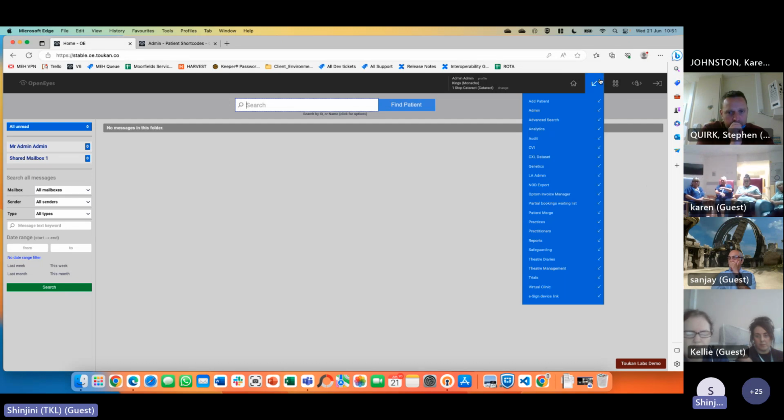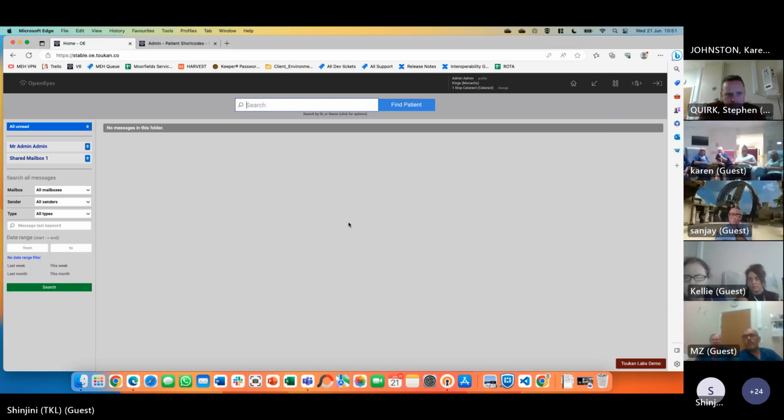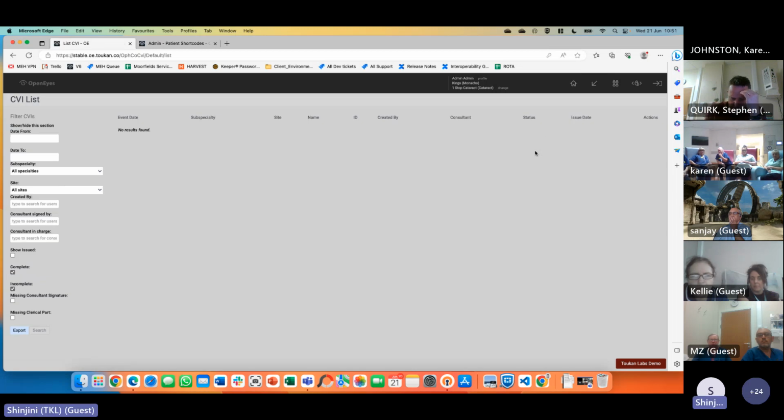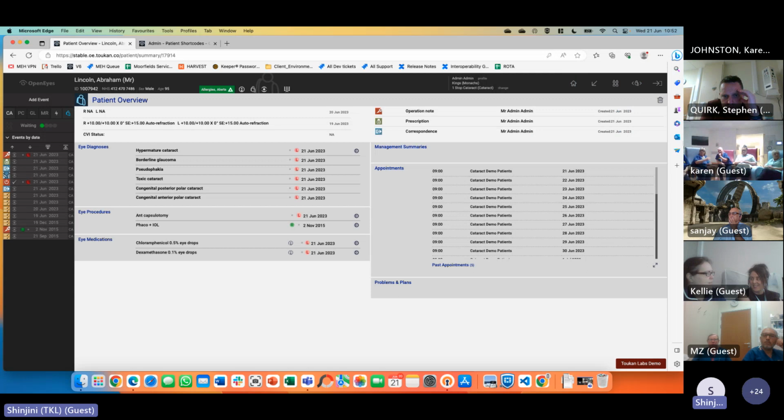Just, do you do CVI? Sorry, do you want to repeat? Okay. Right. So, what else to show? You mentioned CVI. So do you record and submit CVIs for patients? Yeah. Okay, let's record one for Abraham Lincoln.